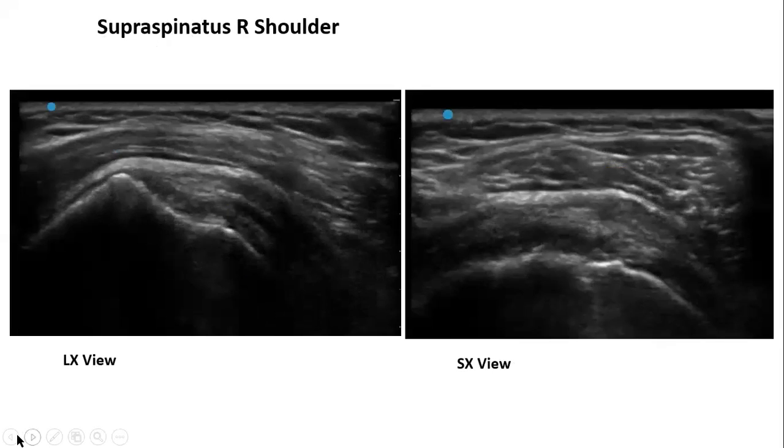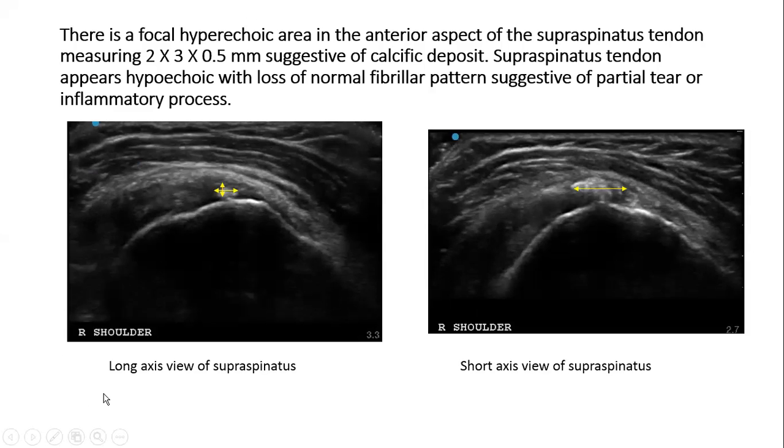So that was on the short axis view, Mohini. It doesn't look like a retracted segment of the supraspinatus. No, it's not retracted. We don't know. So a partial tear can be an interstitial focal fiber failure. It may not be a significant portion of fibers torn and retracted. You can have focal microfailures. You can think of it like that.